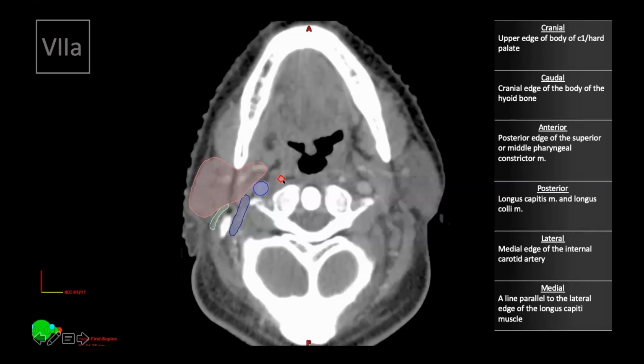So what is done in common practice is, whatever space you do see, you contour that space and not extend all the way up to the midline, because that will be your medial retropharyngeal group of lymph nodes. Contour up to the space, and if you can't see the space, maybe 0.5 to 0.8 centimeter usually makes sense. Just make sure not to include the medial group up to the midline, but using this as a medial landmark is not very consistent.